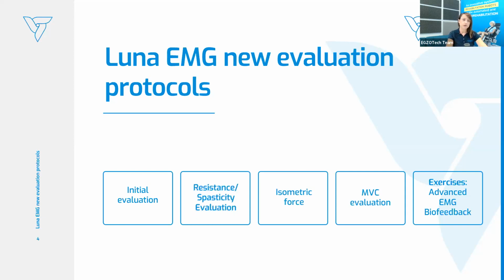But so far, we did not have standardized protocols that you would be able to use in your everyday work practice, so they can be repeated after some time easily, and you can assess the patient's progress. So we decided to add some of the protocols that can help to evaluate and objectify everything even better. And here are our ideas for that.